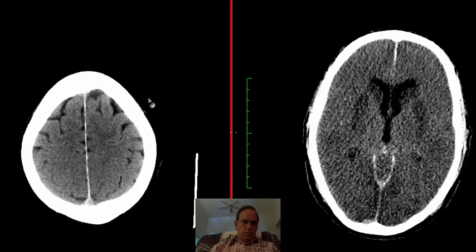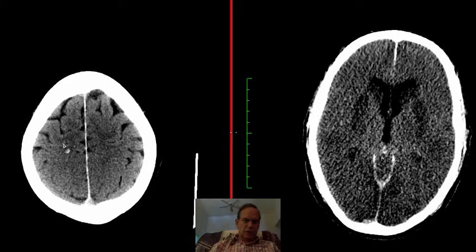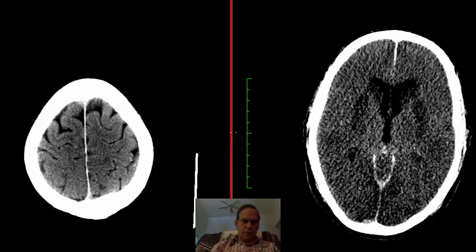So you could argue that, well, we're not having the same amount of gray-white matter differentiation as you usually see, but I think that's a hard case to make, because here you can see white matter with cortex right next to it, and there is a significant difference. If I increase the contrast, you can really see very well a cortical ribbon here.